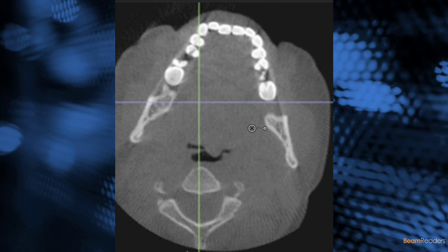And if you take a look at this patient's mandible and maxilla, you can notice that they are way out of alignment compared to the alignment of the spine. And if you look at the area of the airway, you'll see that there is asymmetry in that airway. Again, we don't want to confuse patient positioning with a pathologic entity, because anytime you see asymmetric airway, you have to anticipate that there is a space occupying lesion in the area.